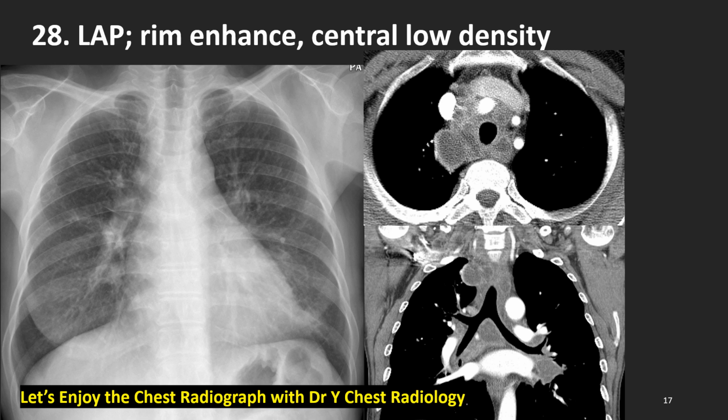What happened to the mediastinal lymph nodes of these patients? Yes, many lymph nodes of central low density. Central low density suggesting caseation necrosis with rim enhancement of granulation tissue. Many round lymph node enlargement with central low density with caseation necrosis and rim enhancement of granulation tissue everywhere.